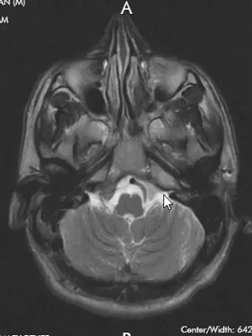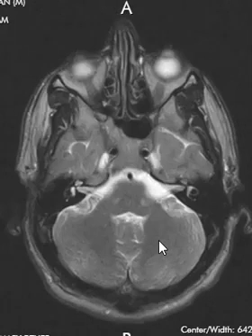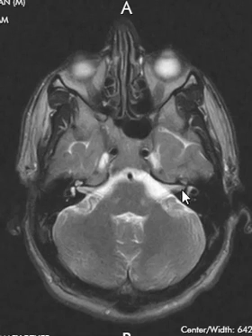As we continue down, we go down to the bottom of the cerebellar hemisphere. Here's the back, cerebellum, or the bottom of the cerebellum. And over here we see an area of darkness. This is called the mastoid. So patients can have fluid in these. They can get inflamed, called mastoiditis, or have other findings. Sometimes tumors can be in here, or inflammatory conditions, but these are nice and dark, filled with air. You can see air outside of the patient is dark, and air inside here is dark as well.